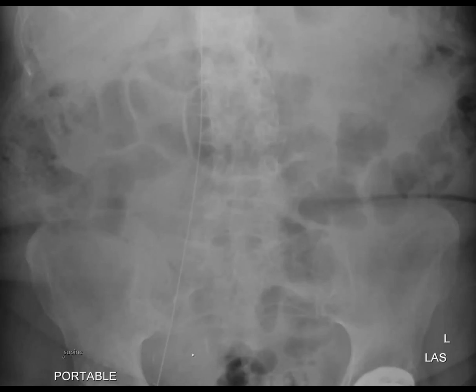But when you're reading an abdominal radiograph on an inpatient, they've got lines and tubes everywhere, right? So we went back further and further, and it had been there for several years. It turns out this was a retained catheter from the intraoperative period of their renal transplant. I don't know exactly what wire it was, but it was left in.